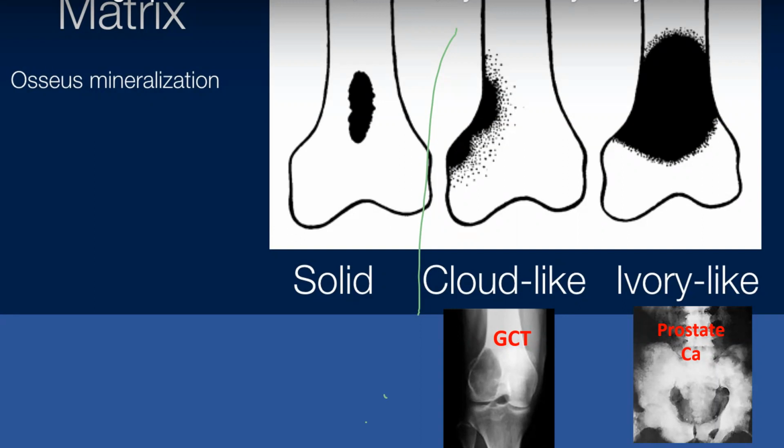But why do we identify it as a giant cell tumor? The patient is in the 40s. The patient has the lesion in the epiphysis, and you see that there's a lytic lesion. And it's very important to know that giant cell tumors, most importantly, occur on the lateral aspect of the distal femur, not in the center, okay?